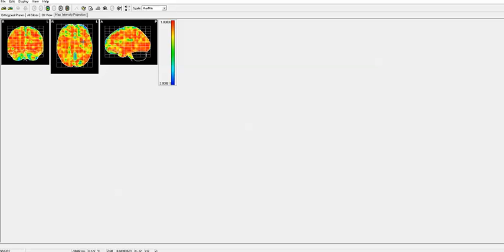And so this is really just a preliminary view of what will be available in the future. Will be available inside of NeuroGuide and also inside the ERP module of NeuroGuide. In the future, it'll come out first in the Evoke Potential module and then later in NeuroGuide itself. So I wanted to show this to you so you can get a view of the future of inverse solutions as we begin to develop these new tools.